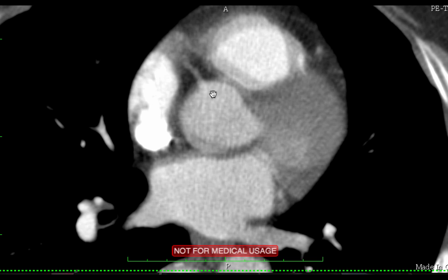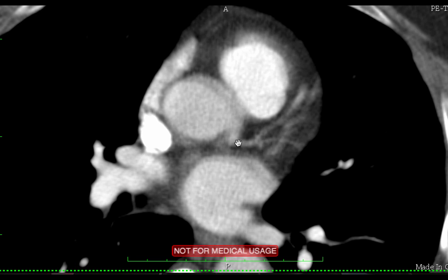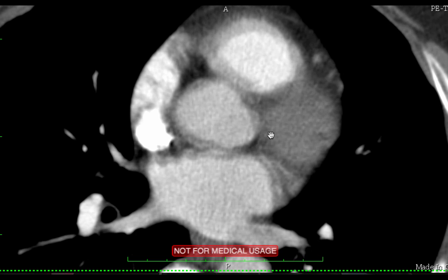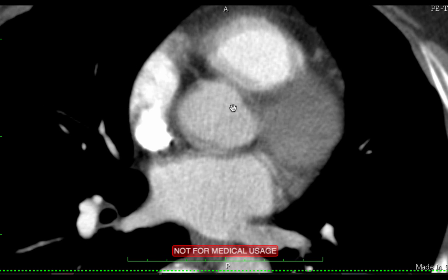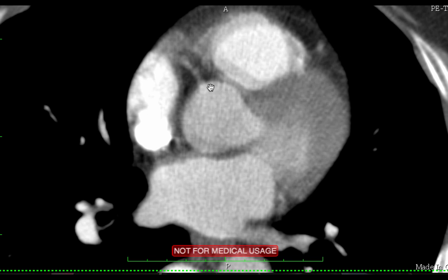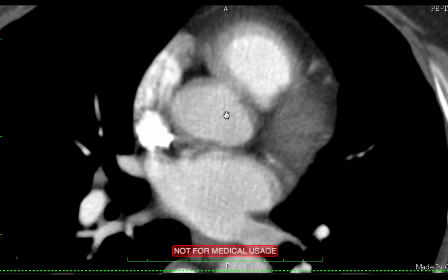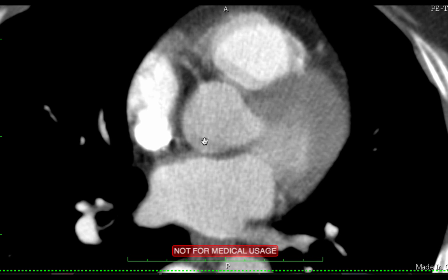So here you have the right coronary artery coming off the aorta, and here you have the left coronary artery coming off the root of the aorta, and both of those are in areas that when the left ventricle contracts, these leaflets flip up and they cover the orifice of the right coronary artery and the orifice of the left coronary artery. So you have to imagine here the valve leaflets look like they're kind of closed, maybe, in the aortic valve. But these leaflets, 2 of them, flip up and actually cover the coronary arteries.